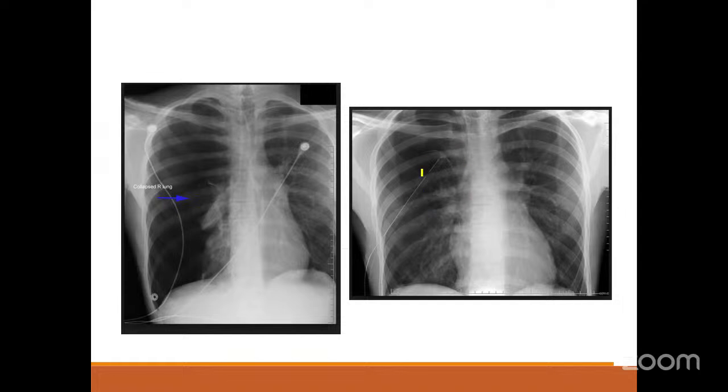The second image is showing you a chest tube placed into this thorax to let the air out. And you can see some bronchovascular markings coming up a little better, but you can still see the lung margin here. There is still some hyperlucency continuing to be there in the upper border. So this is a pneumothorax, and this is an X-ray wherein a chest drain has been placed.